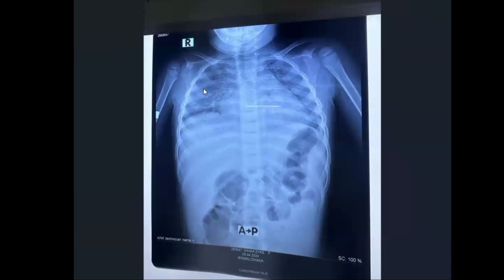What is the X-ray? Is it a plain X-ray or contrast, right? And which organ or which part of the body? Number two. Number three, characteristics of the patient, as for example age and sex of the patient, and position of the patient, as it is very much important for chest X-ray, as it is posterior anterior or anterior posterior view.